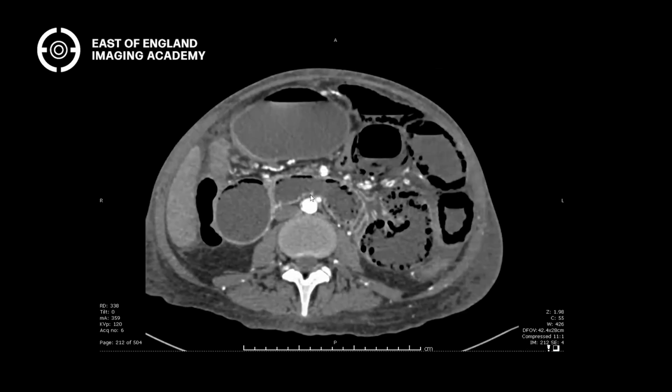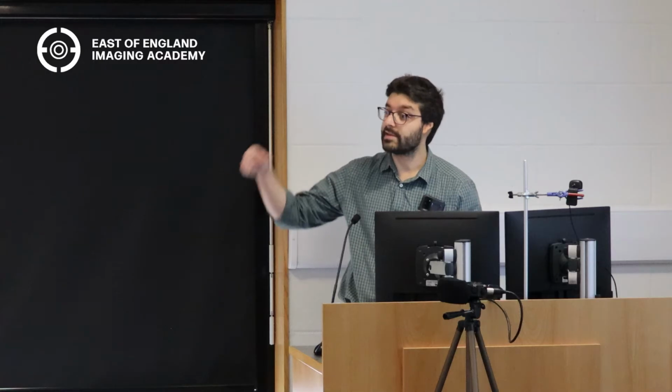And going further than that, because as a radiologist, it's always about going beyond, we've got occlusion of SMA branches, but we also know that we've got splenic infarct. So that means we've got two different vascular territories. So what does that mean? If you've got two different vascular territories which are involved, is this in situ thrombosis or is this embolism? Embolism, exactly. You see what I mean?